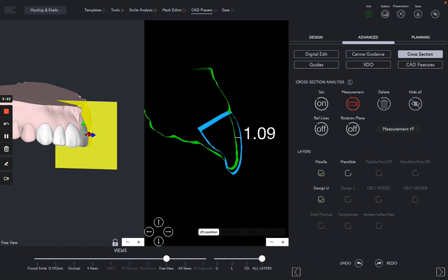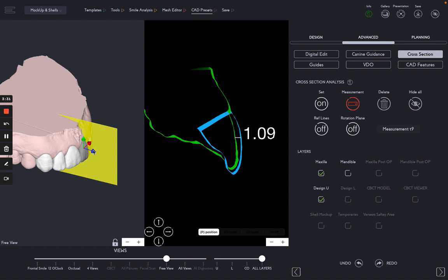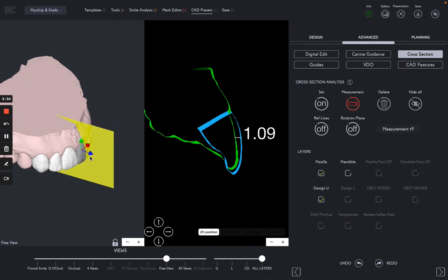You simply tap on the tooth, and you will find here there are several arrows, as you can see here, and then I want to push the tooth so that the thickness of my design is slightly thinner. Okay, so I just push it in, and now as you can see here, it went in, and now the thickness will be much thinner. All right, so I reduced about half a millimeter, so now it's at 0.5.